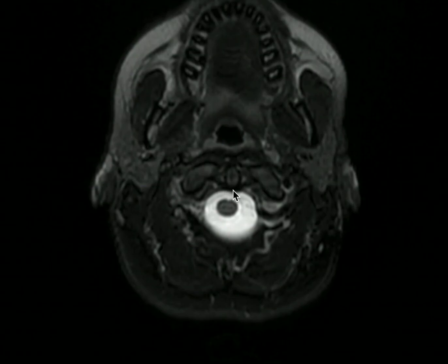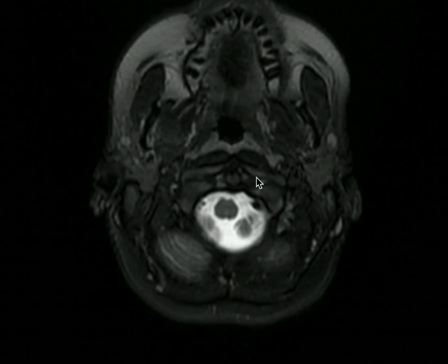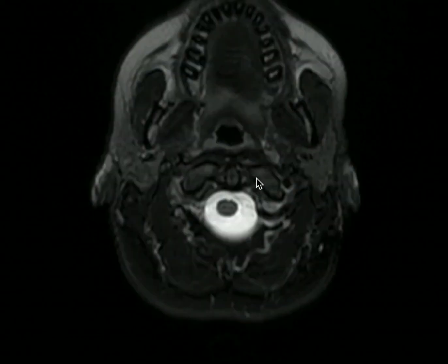The other component will be the longitudinal fibers going up to the anterior aspect of the foramen magnum and down inferiorly. Also on this slice, we're seeing the alar ligaments. The alar ligaments extend from the lateral aspects of the dens on either side, here, and will go up superiorly to the occipital condyles. Let's now look at a sagittal MRI to view these structures in greater detail.